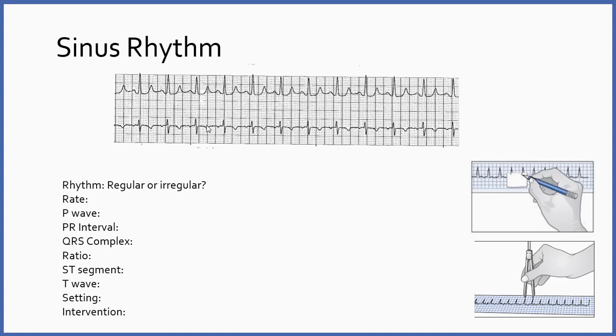So can I say that there's a problem? Not really. I mean, it does look like I have some ST segment depression, but what do I do with that information? Assess the patient, review the labs, look to make sure that the lead is attached correctly. It could be artifact, try to figure out what's going on. So I would have to say that I'm seeing a little bit of ST segment depression.